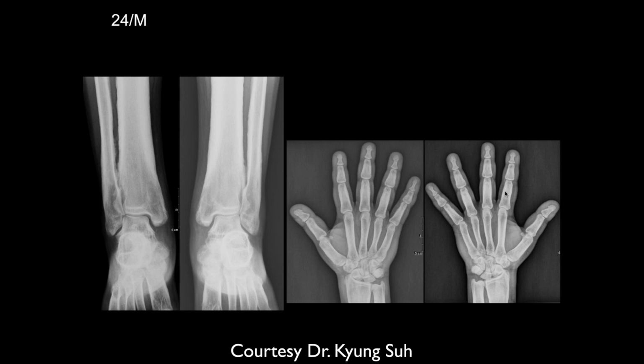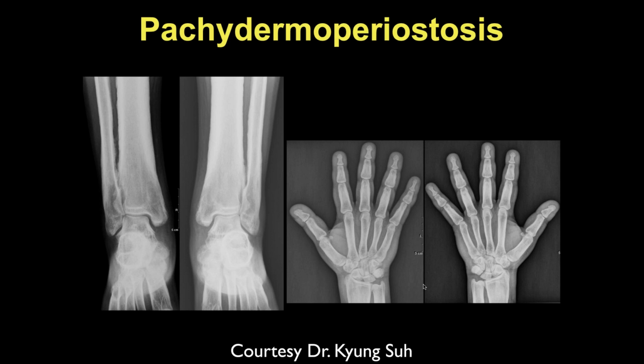Okay, so there's an irregularity of that distal fibula and tibia, a kind of chronic appearing cortical irregularity and undulation. And then looking at the hands, I see a similar finding in the distal radius maybe and the distal ulna. Right. So yeah, pachydermoperiostosis. And you could think about melorheostosis, but it's usually not this diffuse, right? Yeah. None of the bones are normal. No.